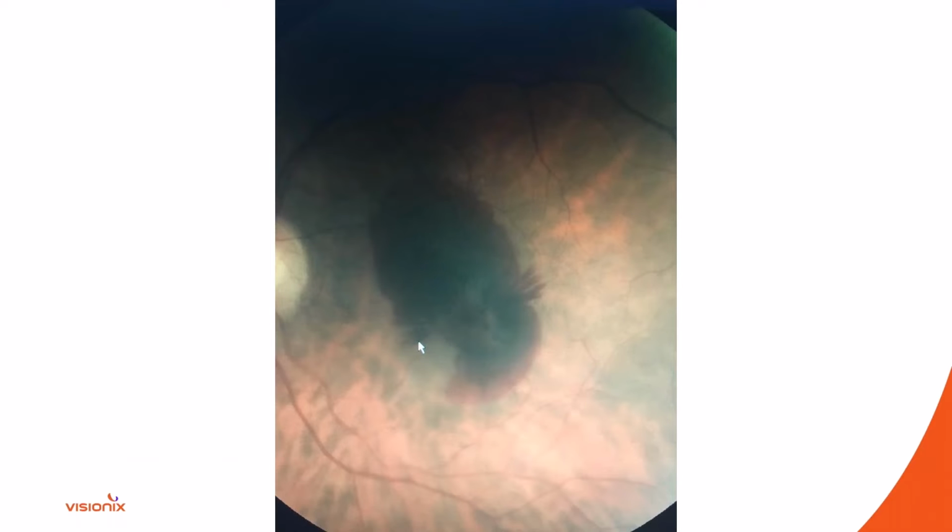So here was a case. My wife actually saw this case. My wife is an OD, practices here at the college as well. And I remember I was traveling somewhere, I was speaking somewhere, and she texted me this picture and she said, what do you think is going on in this mid 70-year-old female? What do you think's going on?